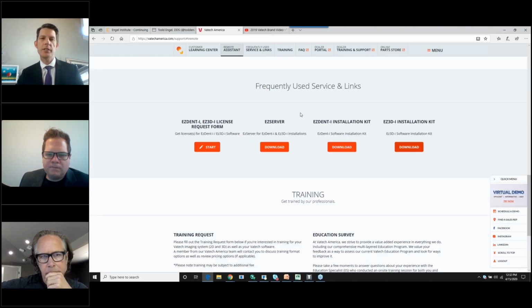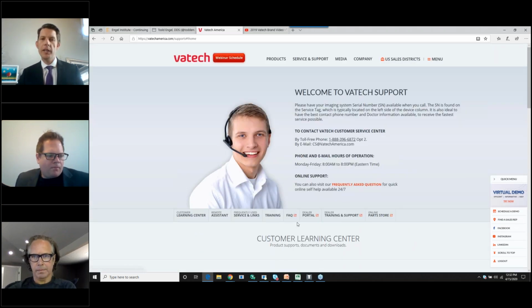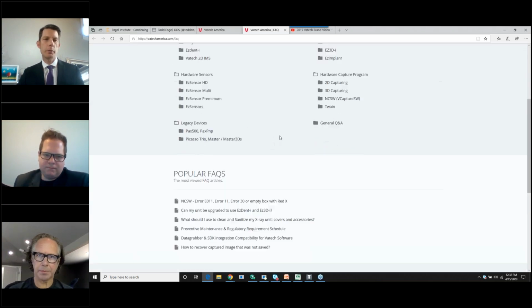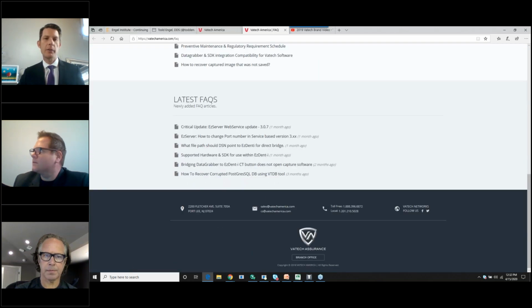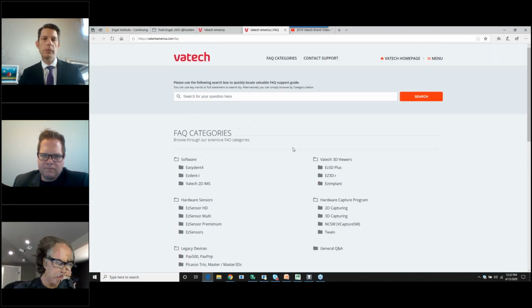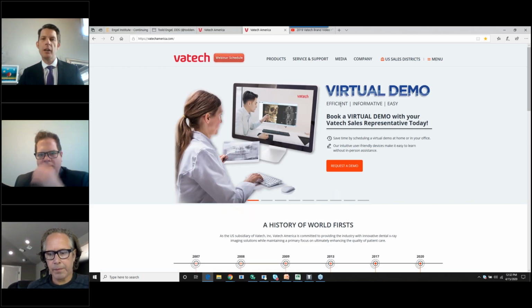Other things I get a lot of questions on is, I need to get a hold of tech service really quick. What can I do? Really, if you look at your FAQ section, every week we talk about this, really good points. Popular FAQs: how do I upgrade? How do I get the latest version? I came in the morning and I've got a data disconnect button. We basically have a lot of these icons here, so you can click and watch. How do I export some data there? So I really wanted to point that out.